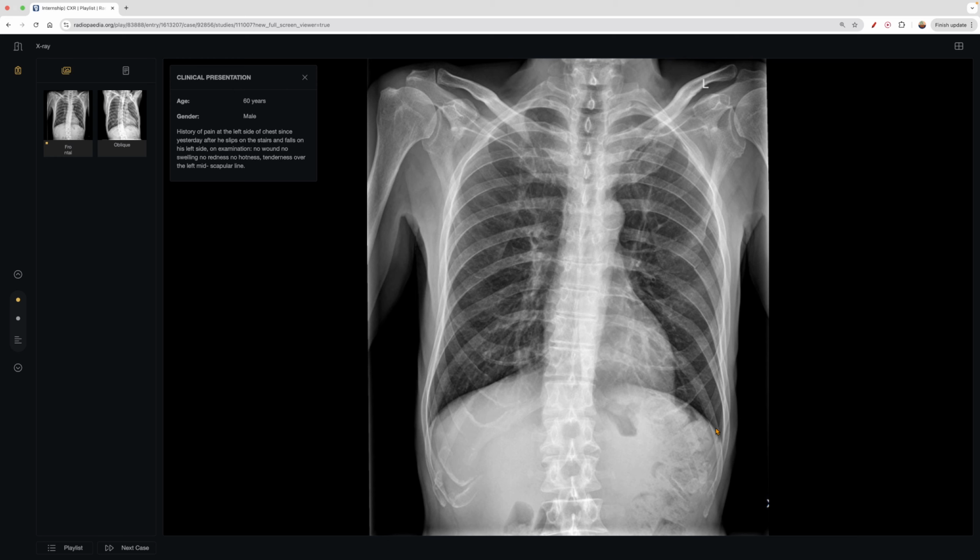And then we come down, the angle's fine. Coming back up, nothing too much else to note. This side is fine. Come back up and down. Come back here, trachea, right, left, no widening, heart's rather appropriate in size. And then one thing I did see down here, and just very briefly, you can see the cartilage is a little prominent. It's just calcification that happens when you get a little older.